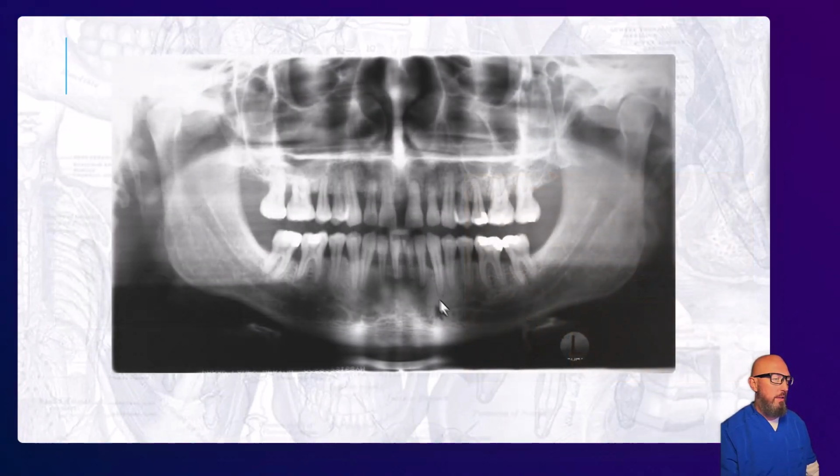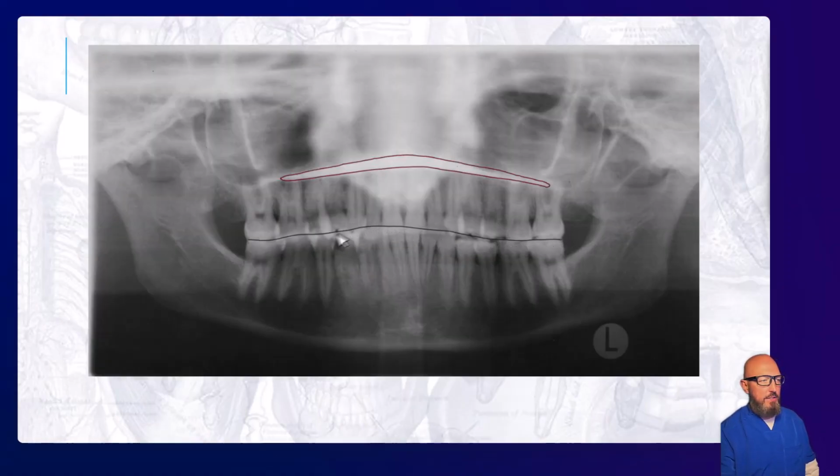I'm just going to go quickly through some of these. Nice flat occlusal plane in this one. This is pretty ideal. Here we even have lines directing you. The chin is up a little bit. And what does that do to the hard palate line? Even just a little bit of kind of head back, chin up creates that hard palate line to project over the root apices of the maxillary teeth. So you can see why that's a bad error to do.